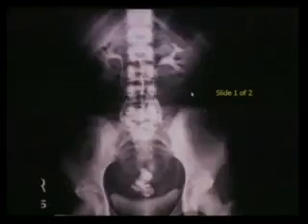This is an excretory urogram, an IVP, when we used to do them. We don't do these anymore. You could get an image just like this when they do a CT, and afterwards they get a KUB. You could see the nephrograms, the excretion, the ureters. Here's the urinary bladder, and here's this large calcified looking thing. And if we really magged it up, what do these things look like?